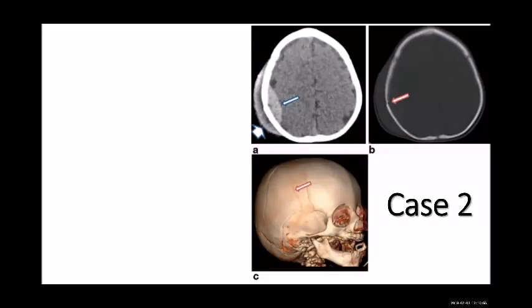I think this is an extradural hematoma, maybe with a subgaleal hematoma too, and with a fracture of the bone.